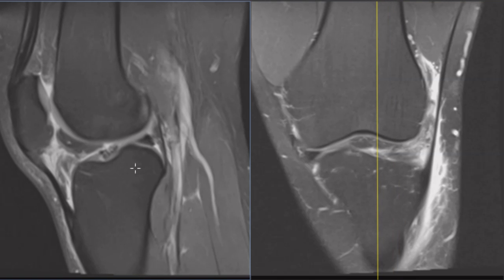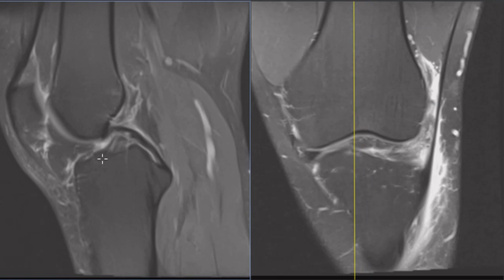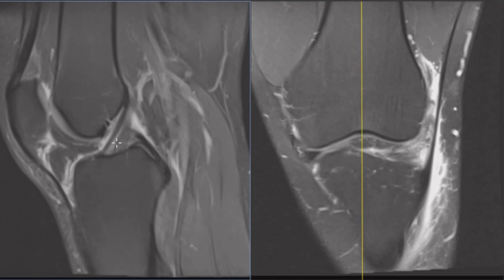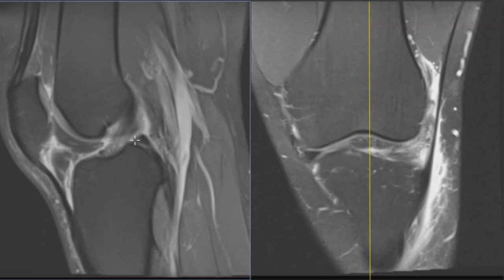So there's no fracture, there's no bone contusion, and his ACL is right here. This is the anterior cruciate ligament, comes off the back of the femur to the front of the tibia, looks normal. Has a few little components here that fan out towards the bottom. This is a pristine, normal looking ACL. His posterior cruciate ligament, the PCL, goes the opposite direction. It looks completely normal, so no ACL tear, thankfully, no PCL tear.